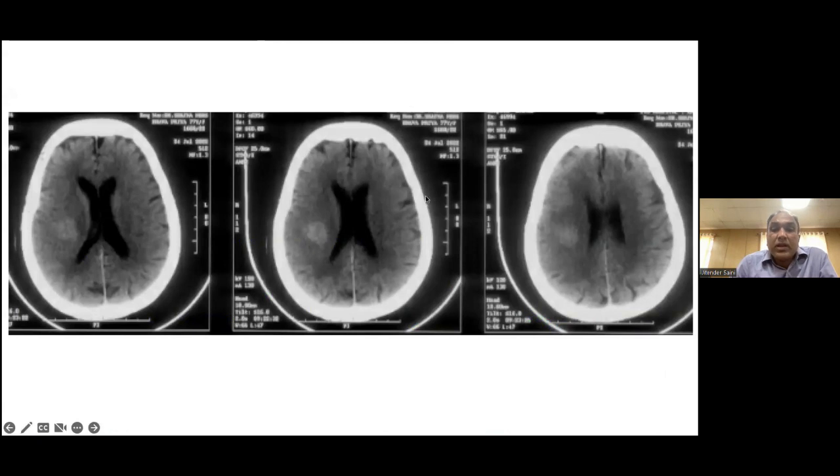For example, in this particular case, an old CT scan showed a focal lesion which looked hyperdense. You can see this is the cortex, which also looks slightly hyperdense compared to the white matter. But this is in the white matter. So there is some lesion present. And here the sulcal spaces can be seen much better, while here the sulcal spaces look slightly effaced.